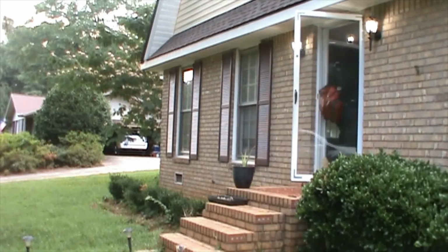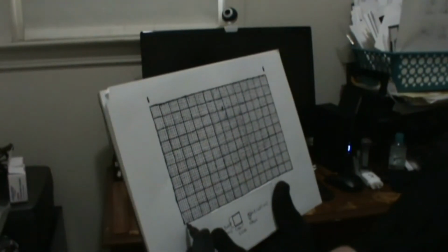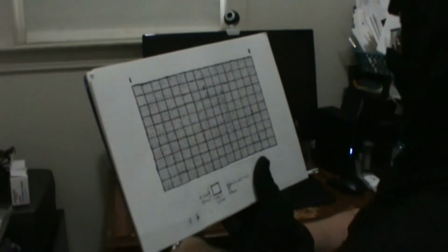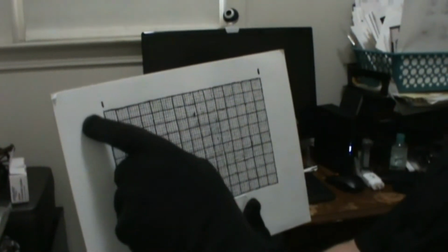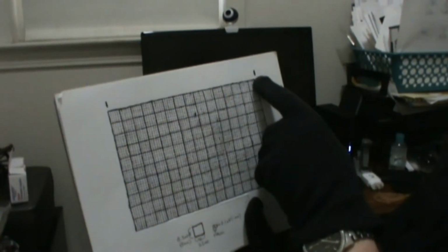Alright, first things first, let's draw out the EKG lines. All done. Alright, now as you can see, an EKG paper consists of this nice little grid. Now looking at the very top, if you'll notice these two big hashes here. On your EKG, whenever you see these big hashes, that represents a passage of 3 seconds worth of time.